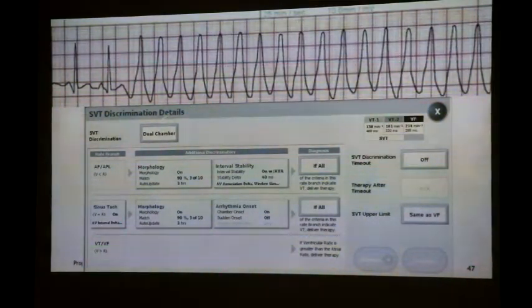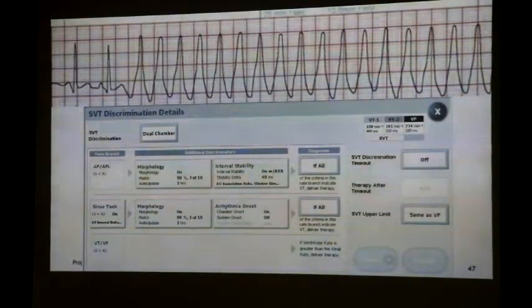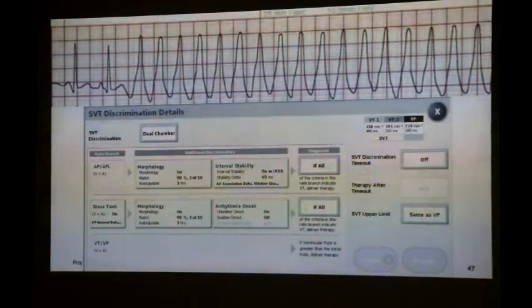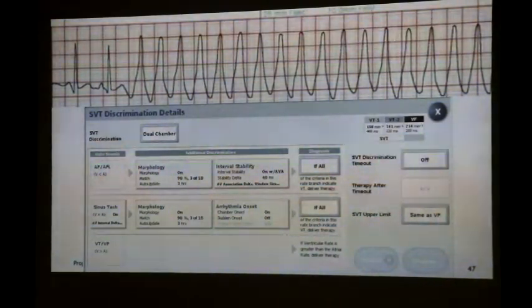This is our algorithm, but we'll just inject the rhythm into it. Let's see what happens. So that rhythm there, don't complicate it, it looks like VTAC. It starts suddenly and looks different. It's regular and monomorphic. It doesn't look like there are any retrograde P waves in there. So it's VA dissociation, more V's than A's. So what does our algorithm do with this?